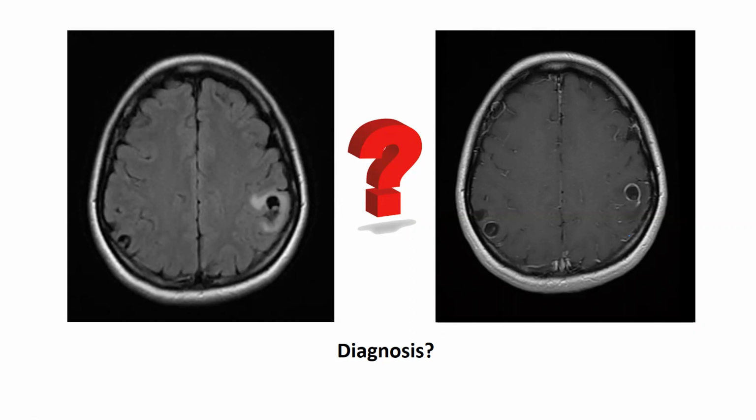Vesicular stage. Okay, which one is vesicular? Sir, the one in the right hemisphere. So this is the vesicular stage you are saying? No, sir, that is granular, sir. The one in the right hemisphere. Oh, right hemisphere. So the one in the right hemisphere, this is the vesicular stage, sir. But both look the same, so why do you say this is vesicular?